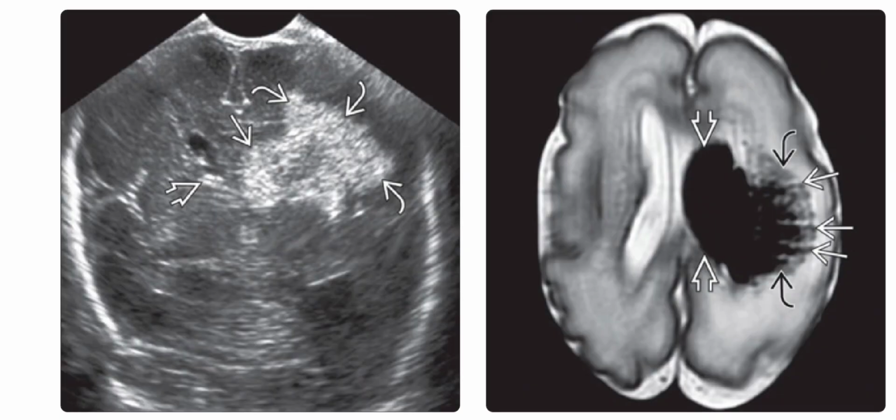The left image is the coronal transfontanelle ultrasound in a premature infant, and it shows a small increased echogenicity due to the germinal matrix hemorrhage in the right caudothalamic notch. The germinal matrix hemorrhage on the left is obscured by the intraventricular extension and very echogenic associated hemorrhage, PHI.